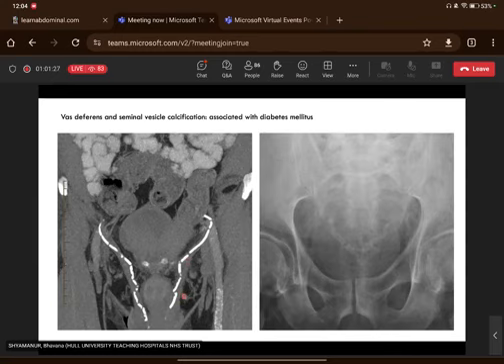This is a coronal section through the groin, so you can see the femoral vessels on either side. Presumably the scrotal or funicular part, the inguinal segment, and then the pelvic segment running in medially. Here's also an X-ray which shows them calcified, and you can see the distal pelvic parts converging together, and there's also a bit of incomplete calcification of the seminal vesicles.